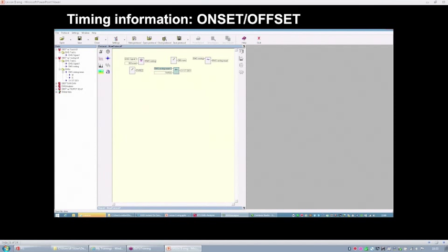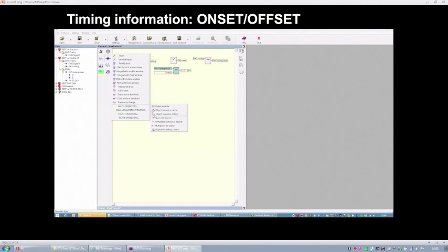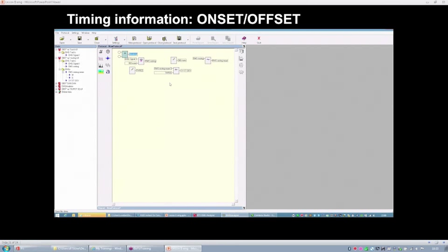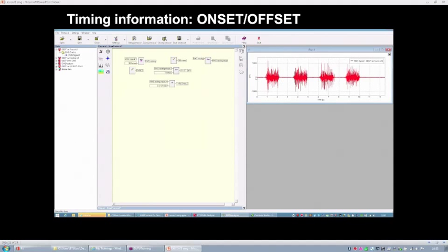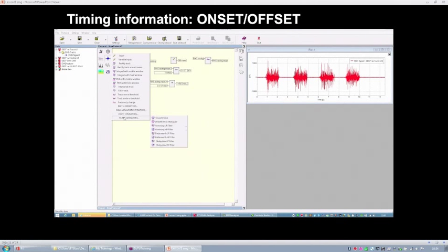And now I'm going to sum this value to the mean value of the EMG activity during the resting. This value will be the threshold value to define the onset and offset of muscle activation during the activity. Now we can consider the real activity of the signal, and we are going to define the computation of the onset and offset time.